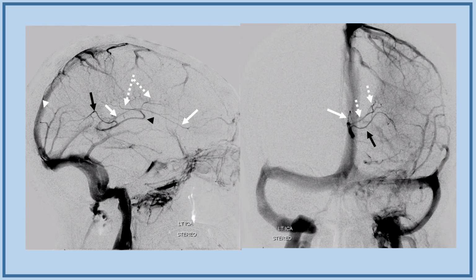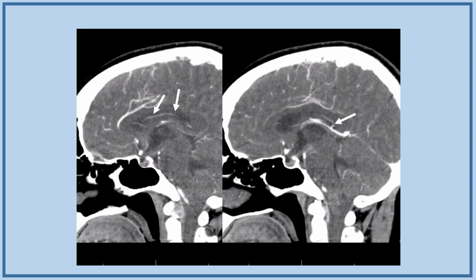And so the false venous angle is when that doesn't happen. There's still a venous angle here, which is marked by that black arrowhead, but the septal vein opens posteriorly into the internal cerebral vein. In fact, its opening corresponds to another confluence with another vein called the medial atrial vein, which is that solid black arrow. And that's a vein that you will see also in the next picture.